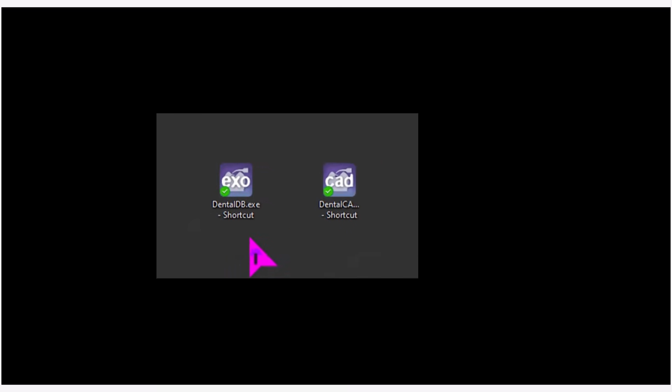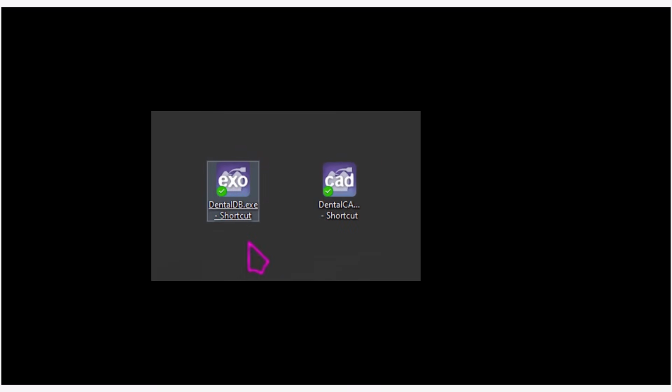Now, on your desktop, you will see two shortcuts, dentaldb.exe and dentalcadapp.exe. Click on the dentaldb.exe icon to launch the software.